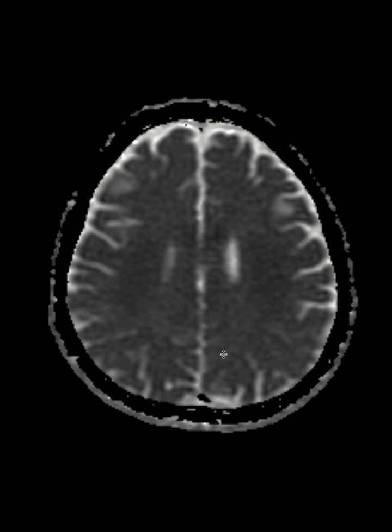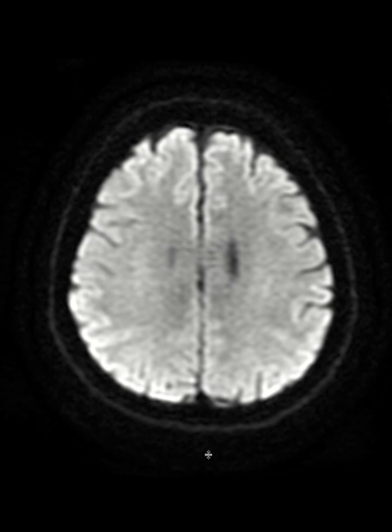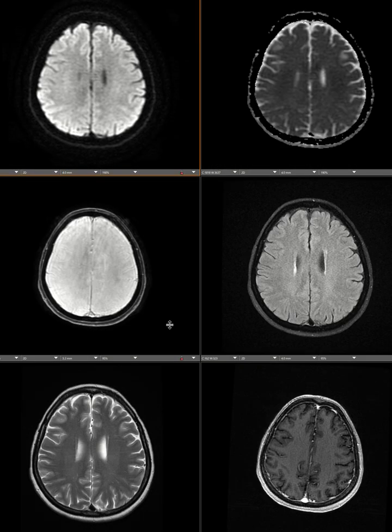then we call it restricted diffusion. Restricted diffusion basically is a slow movement of the water molecules due to some sort of pathology going on in the brain. It can be due to infarct, it can be due to abscess, different processes that cause restricted diffusion in the brain. We are going to look at this very important sequence called diffusion weighted imaging. Okay, we always need to look at it side by side with ADC. It's not going to be alone, so just remember that. DWI and ADC just go hand in hand.